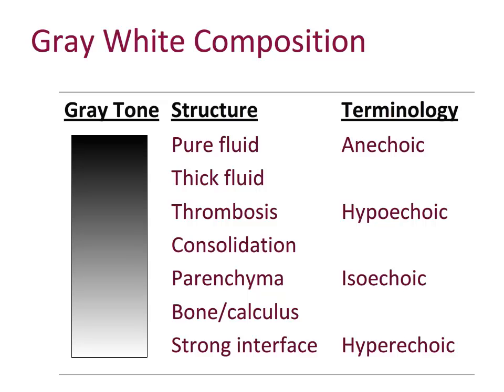And what happens to ultrasound when it hits fluid? You see a black area with clear view behind it. Therefore, fluid is considered a great acoustic window. And what happens to ultrasound when it hits bone? You see a white leading edge, then shadow behind it. Again, just like air, you cannot see past bone. And what happens to ultrasound when it hits soft tissue? You see gray layers and boundaries. You will lose some of the energy, but some will still be transmitted through.